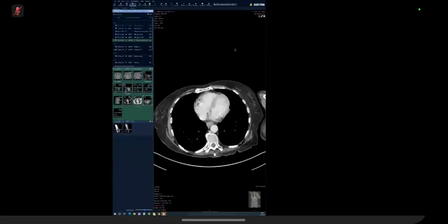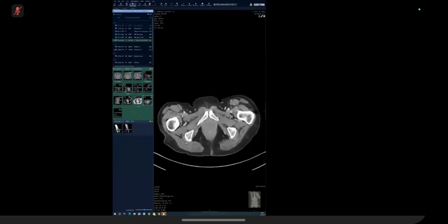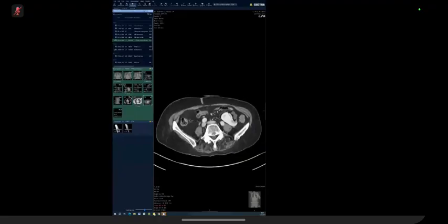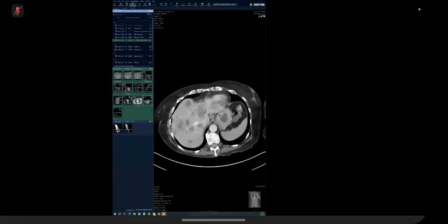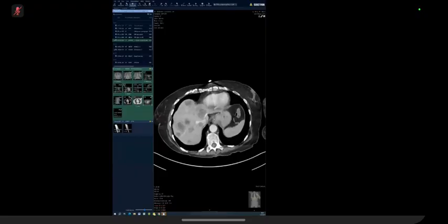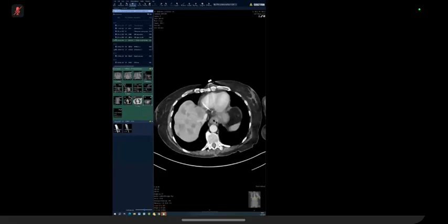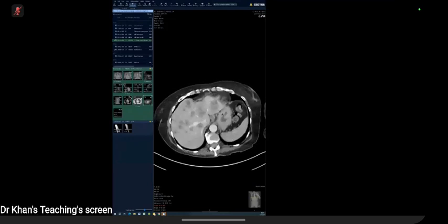When you have liver lesions but the lungs are normal, you're automatically, rightfully thinking GI tract. So you said colon. Unless it's a CTC, they're not going to make you look for a very tiny circumferential bowel thickening on a CT. It would be something more obvious. You picked the liver lesion. You did not talk about the necrotic looking nodes right next to it, and that's one. That's two. And you picked the stomach wall thickening. The minute you picked it, you should have noted that there were nodes next to it. And this patient actually did have an esophageal primary with adjacent lymphadenopathy and the liver mets.